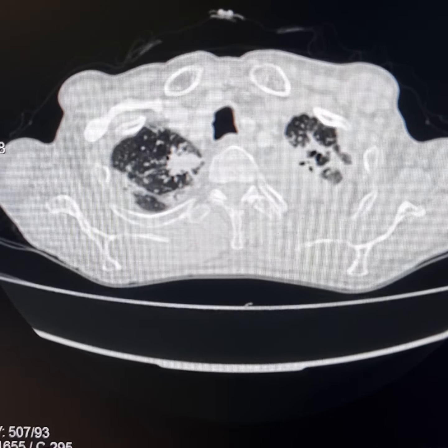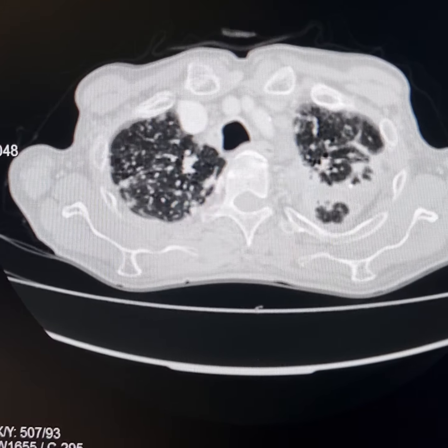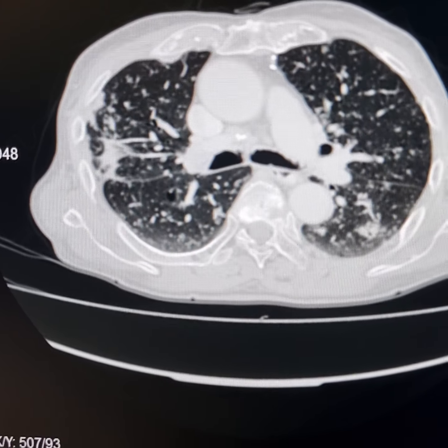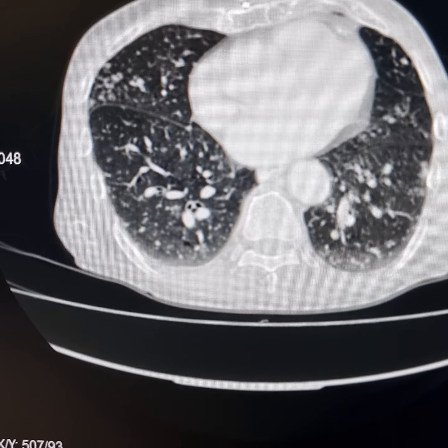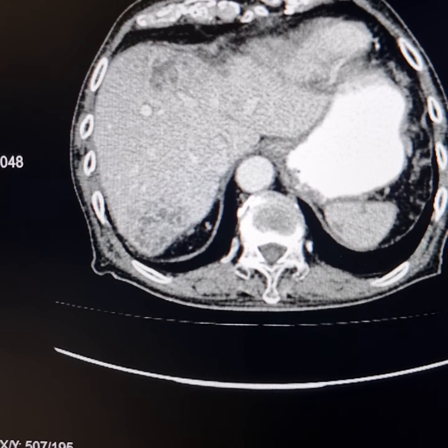The contrast enhanced scan of a 72 year old male. The patient is bed bound because of CVA for the last many years. Now the pulmonary findings are those of pulmonary tuberculosis, quite extensive. Now the patient has presented with high grade fever with rigors.